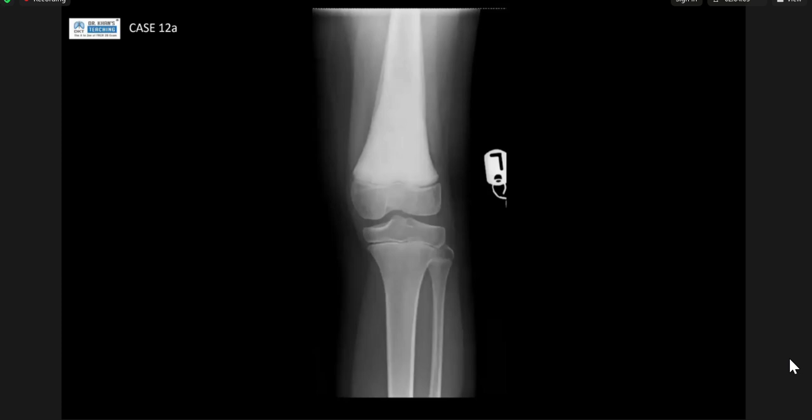my differentials would be. Before you get to differentials, can I stop you and just think about whether you can see any aggressive or non-aggressive features on the radiograph? I am not able to differentiate whether this is a lucency beneath the cortex or a periosteal reaction. So I would say it is a periosteal reaction and attribute it towards an aggressive feature of the lesion. Okay. Is there anything that you would like to know about this patient before you start to give a differential?